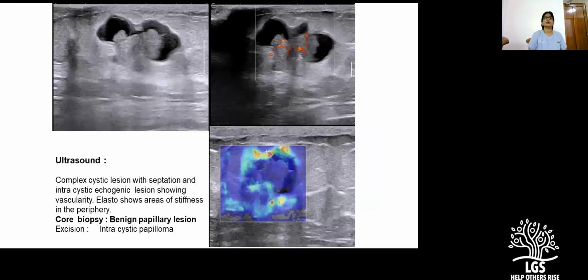And a corresponding ultrasound scan shows a mixed echogenic lesion. So this is a cystic area within which there is a thickening of the cyst wall, if you see here, and within which from one area there is a solid growth protruding into this cystic space, which is irregular, and you see some spiculated edges as well.